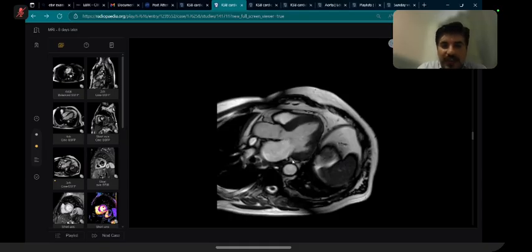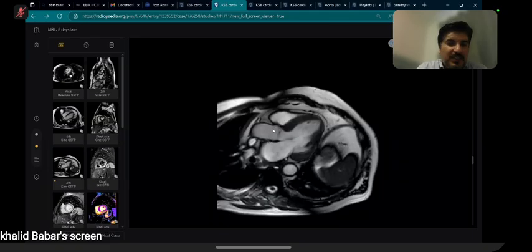Usually, aortic root has 3 segments. This is the sinotubular junction. It has this middle bulbous section, which is called the sinus of Valsalva. It has an inferior portion, which is called the annulus. So it has annulus, this is sinus of Valsalva, and this is the sinotubular junction. And from this commences the ascending aorta, the tubular portion of the ascending aorta. Here you can see this is the left ventricular outflow tract, and this is the aorta. And you can see part of the right ventricle as well here. So this is the 3-chamber view.